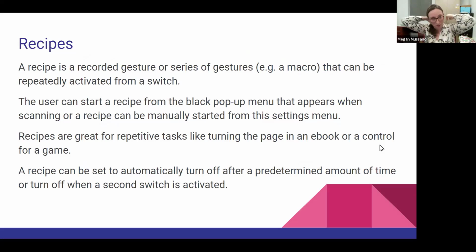What I'm going to do now is show you a recipe. The recipes on an iPad are a set of recorded gestures, or a series of gestures that you can put together. So the one I'm going to show, the iPad Switch Basics, we have one recipe that includes the left swipe, the right swipe, and the tap the middle of the screen. And I link all those together so that anytime the parent or the teacher turns on switch access, they could access all three of those functionalities.